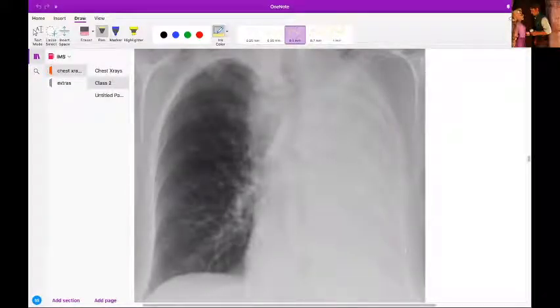Not lung. So it's not an effusion. Okay, there is a question like this in Step 2 CK. Everyone gets that wrong. Everyone. Okay, so no, this is actually total lung atelectasis.